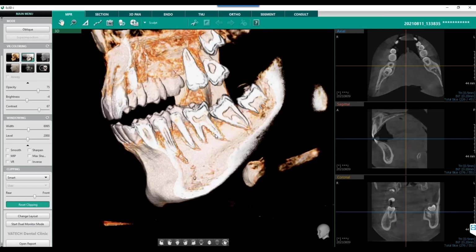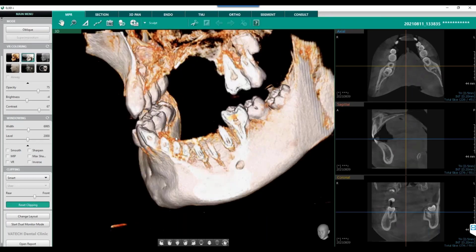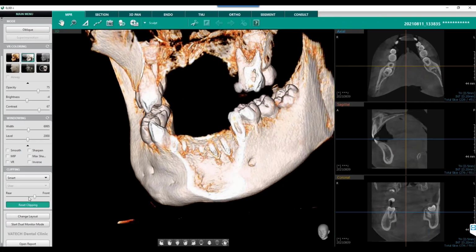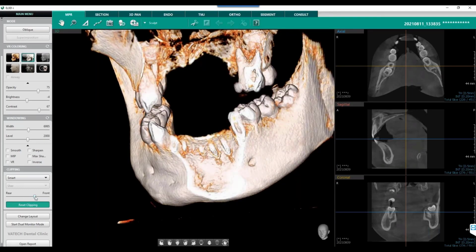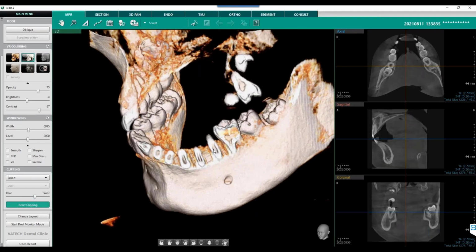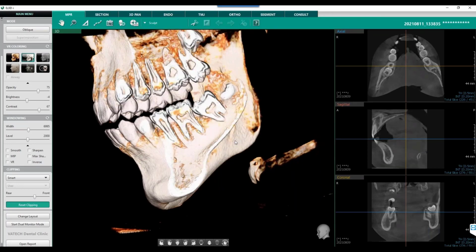So Jim, clipping is basically you're cutting away from that 3D rendering to get to a position where you want it. In this case, you're moving from the rear to the front on that little slider under the clipping window. Yeah, so over here on this clipping window is basically moving rear to front and establishing a central point, and now I can just rotate on that axis. So imagine we have one axis point here and rotate through.